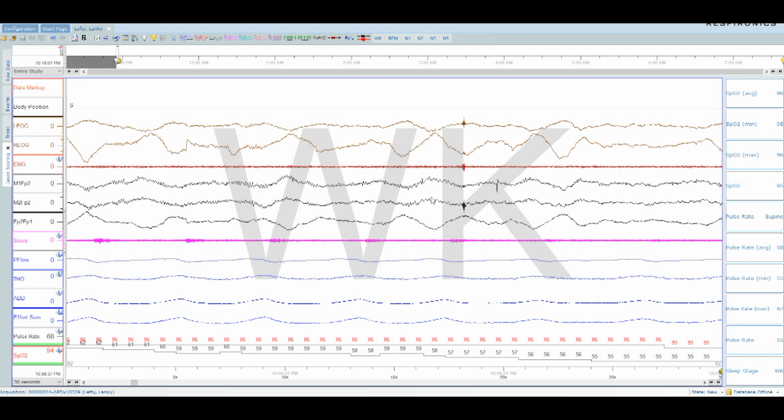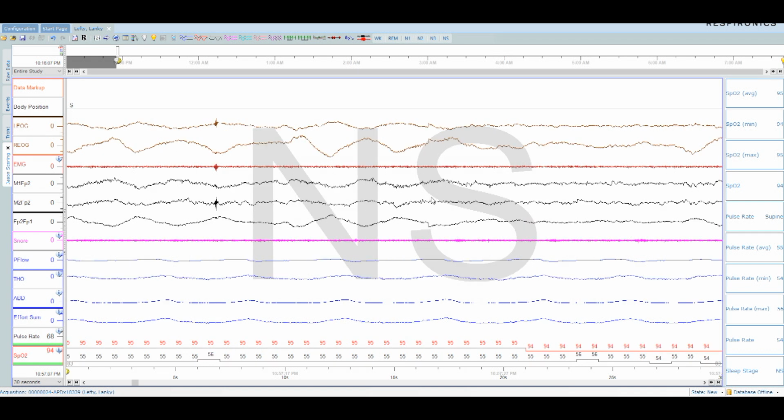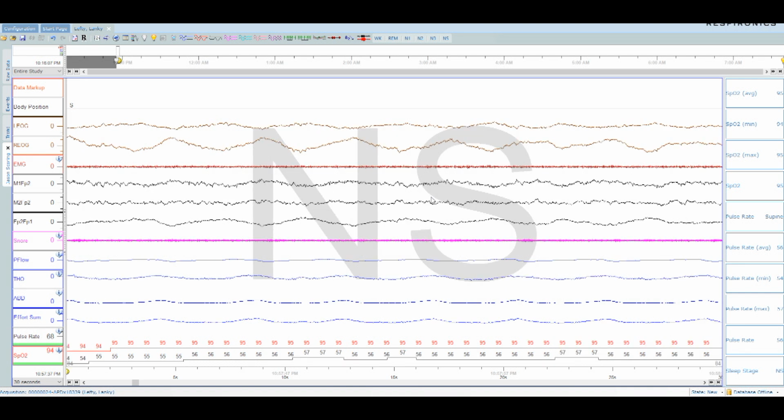So this is wake. I scored it as wake. We advance on. Looks like we have sleep now. I'm going to advance forward just one more just to be sure. Yeah, that's definitely sleep. I'm actually going to call this one wake also. No, I'm not. Yeah, I am. I'm calling that wake. So wake, this one's sleep.